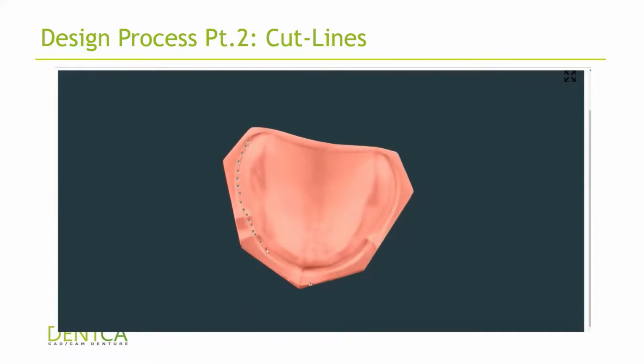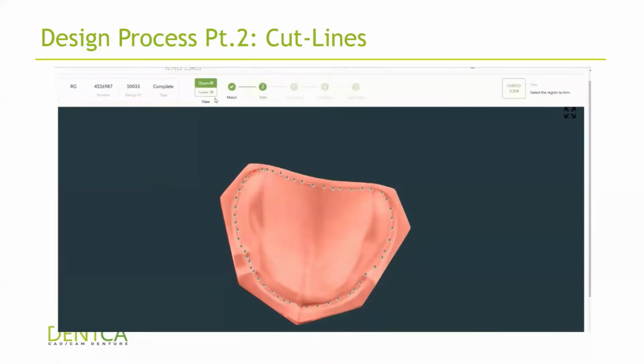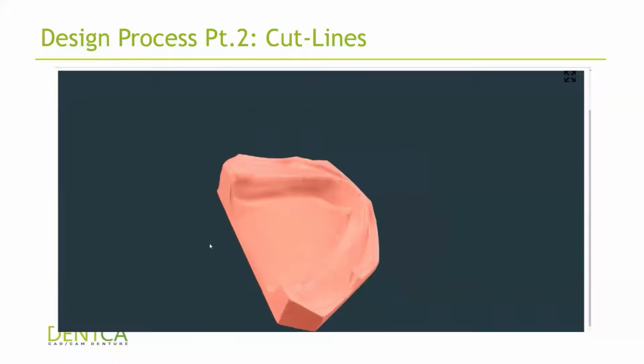I would recommend just going around first, and then if you need to move the dots, move them later. But yeah, by selecting any dot, you can just drag it back to its position or hit delete and it's going to go away. But basically you might want to close the circle first, and then you also want to avoid seeing any squiggly lines. And then once you're done, you go to the lower.